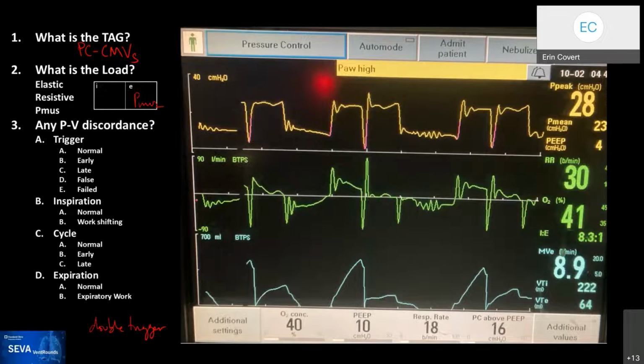It's a very funny looking waveform. I'm wondering what's going on with the drop in the flow initially, in that first waveform. They all look kind of different, but looking at the third and fourth breath, it does look like inspiration starts before flow reaches 0. So it seems like there's auto-PEEP there and it's starting a little early, but they all look a little different.